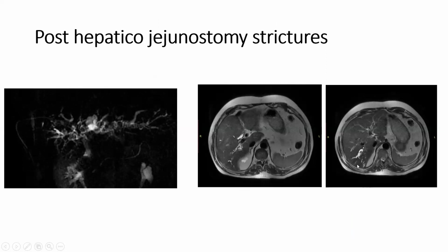So this is the portal vein. This duct lies posterior to this system. This is segment 6, and you're seeing an intraductal calculus. So probably in this situation, the surgeon failed to anastomose the aberrant right hepatic duct while doing the hepaticojejunostomy.